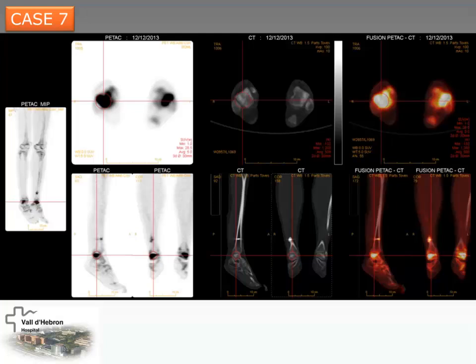She had an osteonecrosis of both femoral heads. And osteonecrosis after corticoid treatment never involves only one. We always have more. It is an osteonecrosis of the talus. Okay. It's well seen, no?